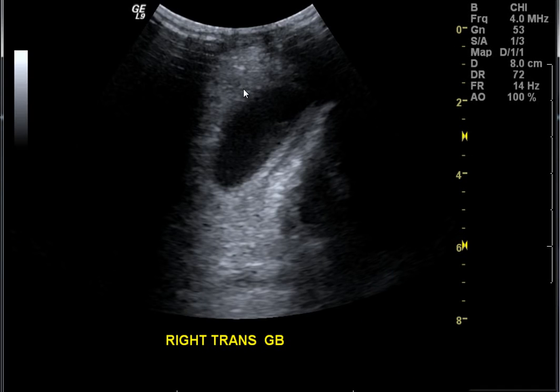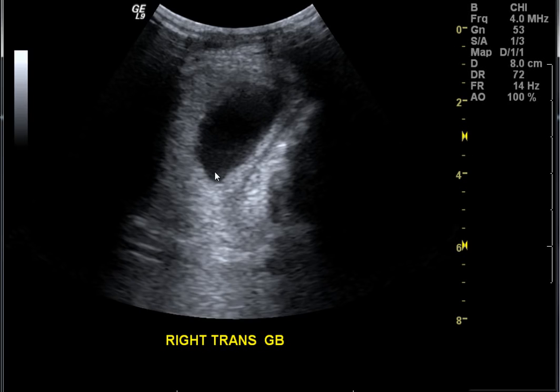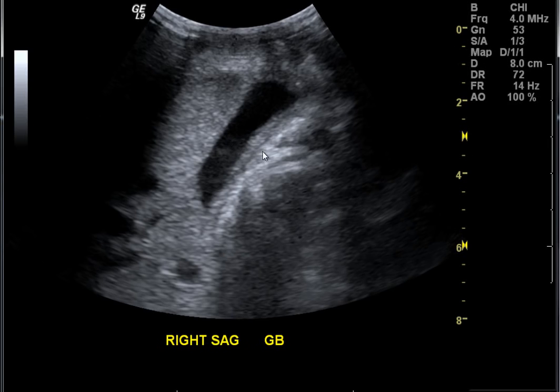Okay. One of the benefits of imaging the gallbladder with ultrasound is that there are no gas-containing viscera anterior to it, so the gallbladder is always very well seen. And what you need to know is what's artifactual projecting into the gallbladder. Because it's anechoic, you can have reverberations and you can have problems with side lobes and slice thickness artifacts. So these are linear areas that project in the lumen, but you've got to be careful because some of them project from the outside in.